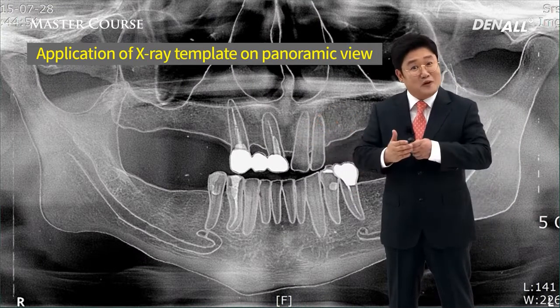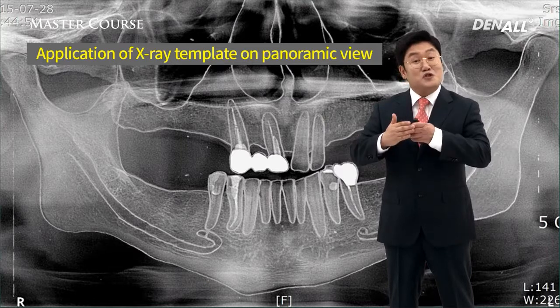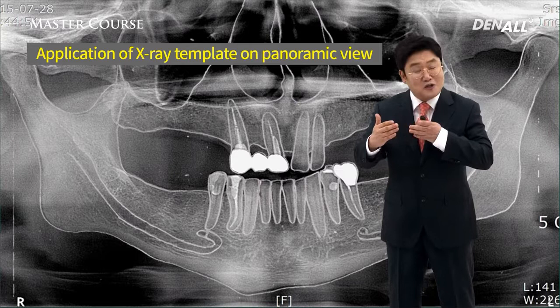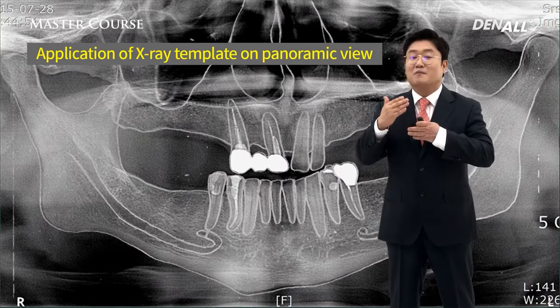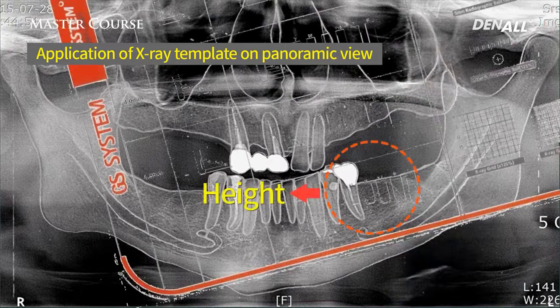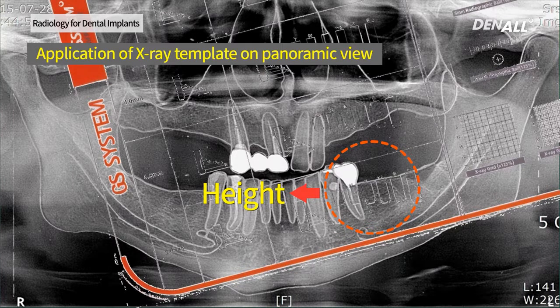The panorama pictures have distorted images. It is mainly vertically distorted. Is it magnified or shrunk? It's magnified. So 125% magnified X-ray template is shown. Before, you didn't recognize it because it was whitish, but it is actually transparent.